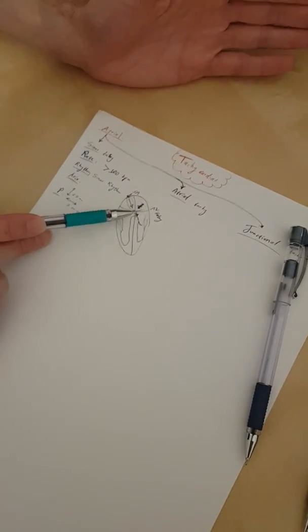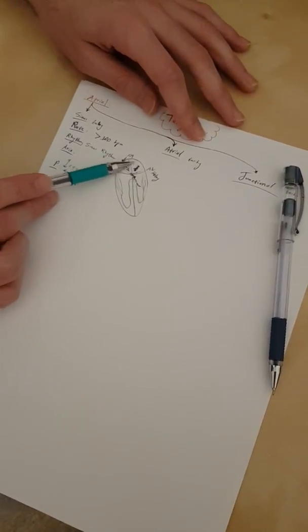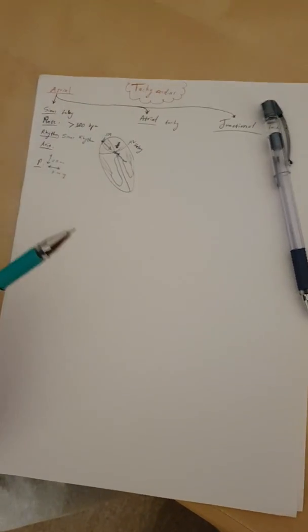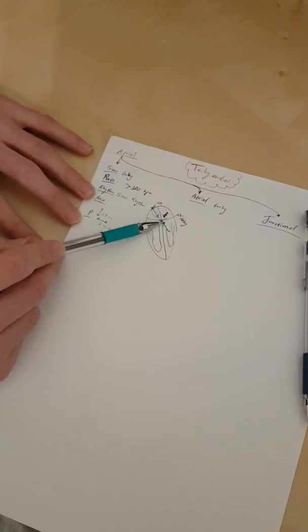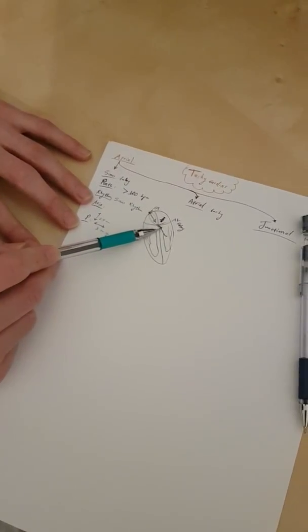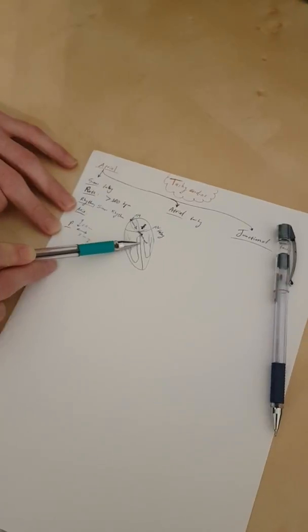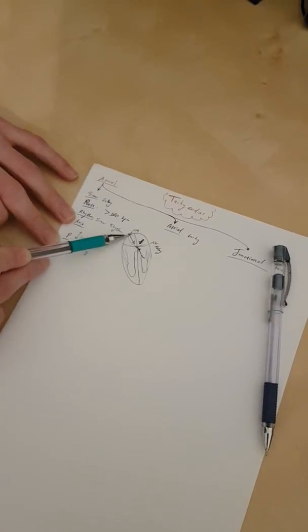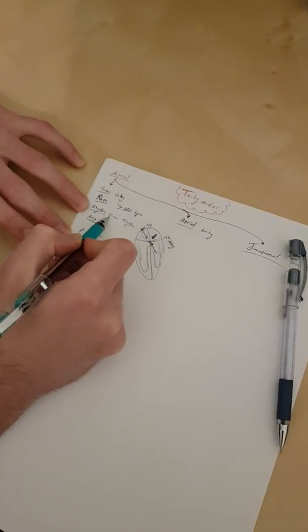Now some other books say no, sinus rhythm or normal rhythm means that everything in the heart, not just the origin of QRS, so everything, even the QRS should be narrow and no STT changes, T wave normal, so it considers that it's just a normal heart rate, normal rhythm. But some books say no, and I think the ones that we take at our university say that until the QRS. So even if QRS is wide, let's say here's a bundle branch block or something, a block here, then we still can consider it normal sinus rhythm, meaning originating normally from the sinus node. Okay, so we will have a sinus rhythm here.